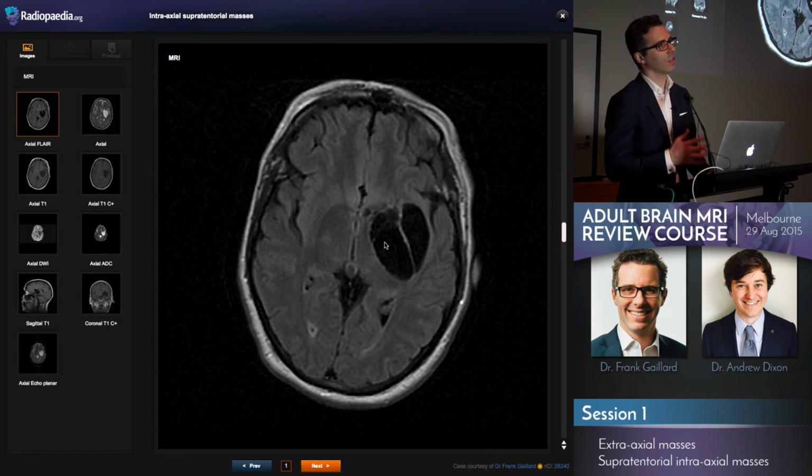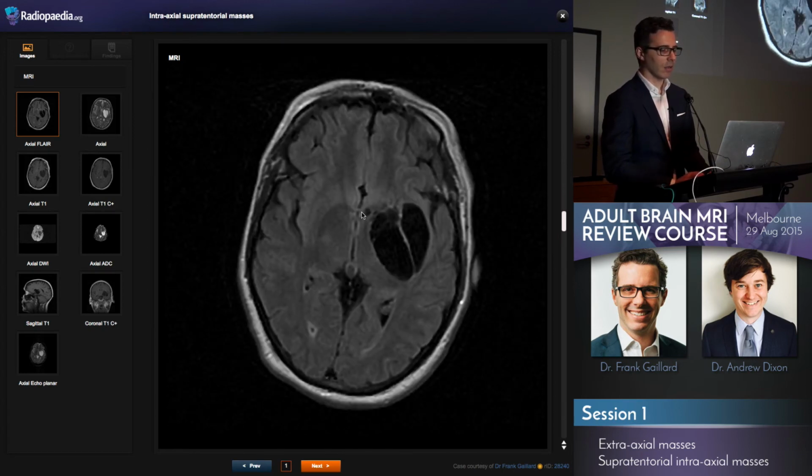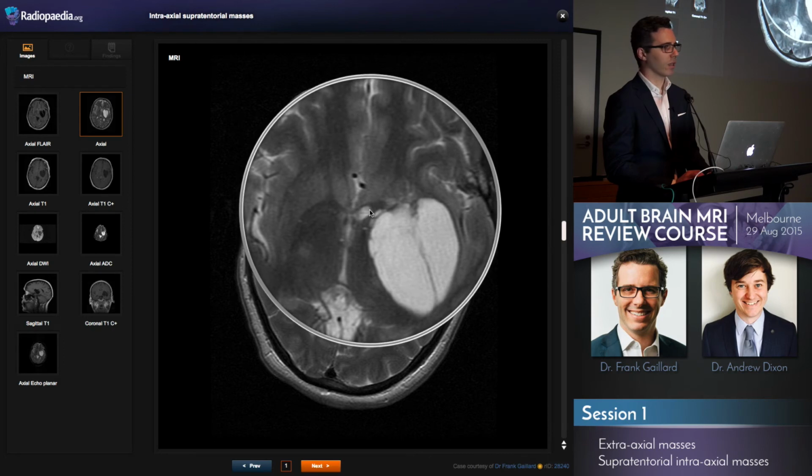The answer's at the margins of it, and that's why having a stack when you're studying from to scroll to the edges of the lesion is really helpful, because it's these little lesions at the edge here that look just like the big one but smaller that you would have no trouble in calling a perivascular space. That one even has a vessel running through it.